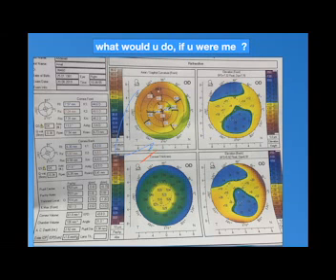So the abnormality in this topography is decentration, a displacement of the thinnest location in the y axis. I have just a steep cornea. K-max is 50 in the upper cornea, and opposing it is a depression.